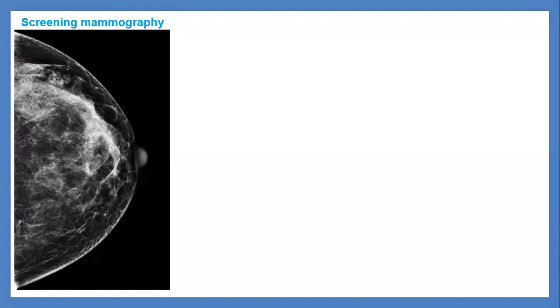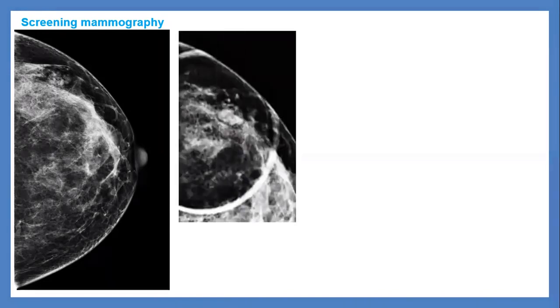That circle. I cannot see the vessels, but I can see a lobulated equal density oval lesion with low density areas. Okay, so yes, it can be a mass like hamartomatous mass, with no calcification. So it could be a lymph node. Intramammary lymph node. Okay. So I would like a spot magnification view.